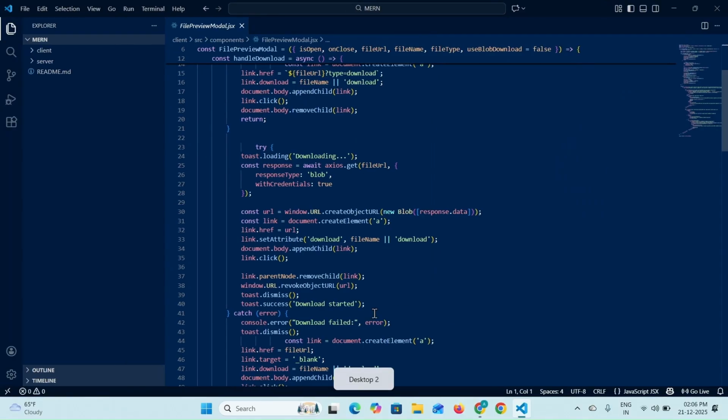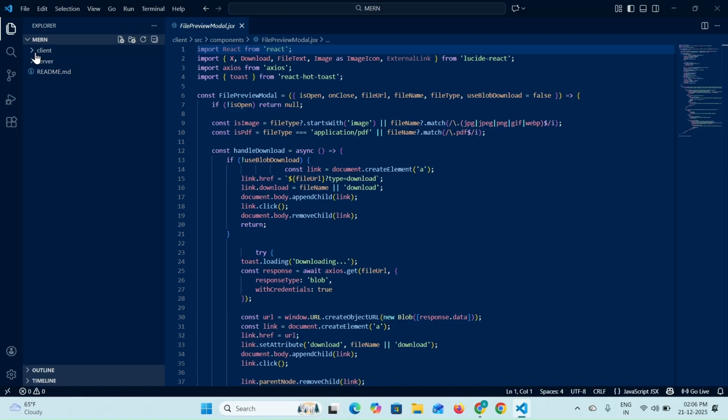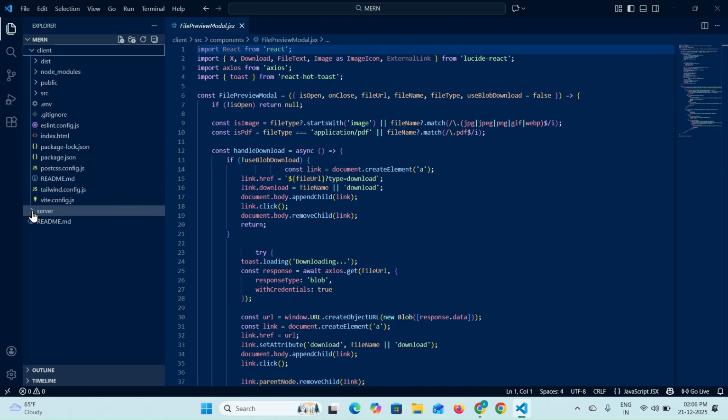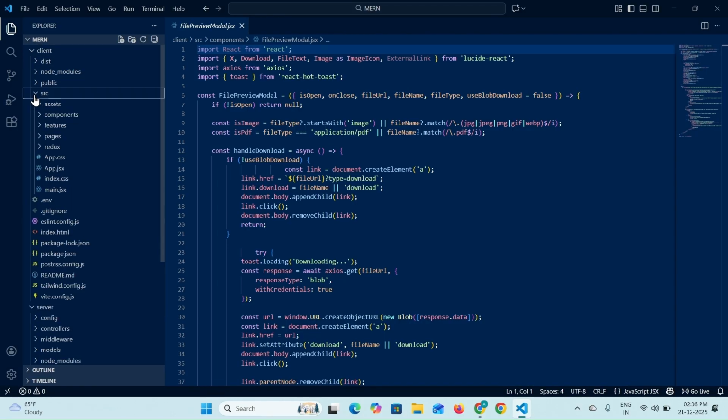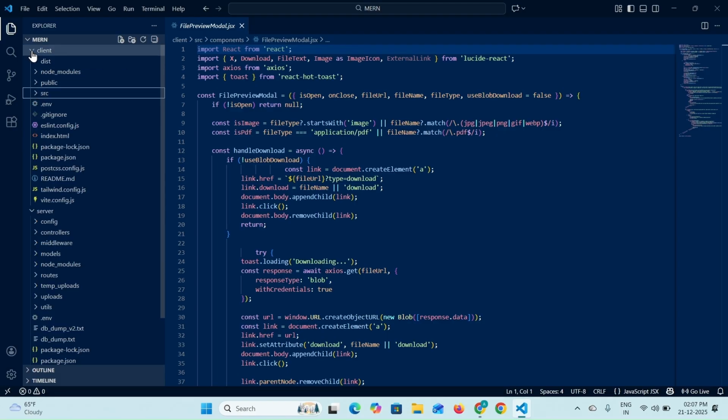Hello everybody. Today I am going to present my project titled Software for Healthcare and Biomedical Device Management. This project focuses on how software can be used to monitor patients' health data generated from biomedical devices such as heart rate monitors, blood pressure machines, and oxygen sensors.